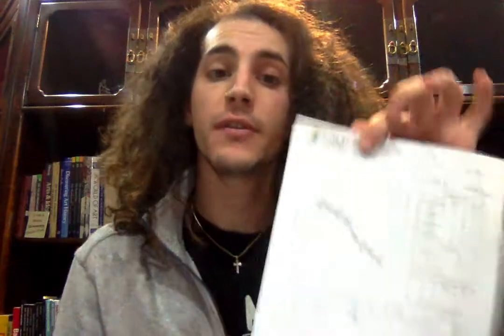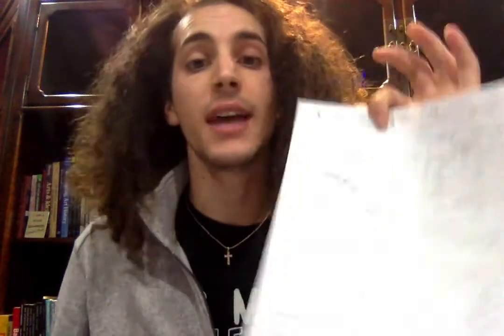Hi, and thank you for joining me for this audiogram discussion. I'm going to be presenting an audiogram and describing some of its key components. The patient for this audiogram is a 70-year-old, and with that comes some pretty unique and also characteristic configurations.